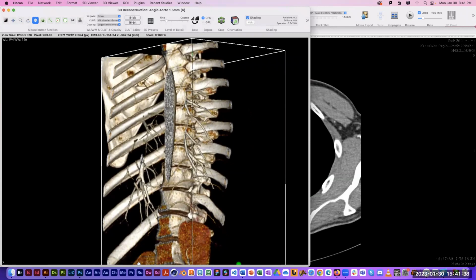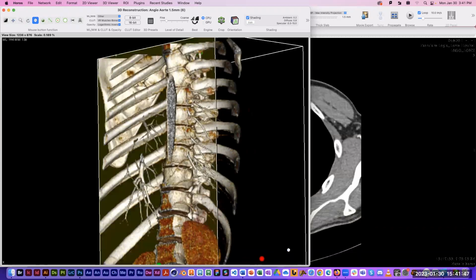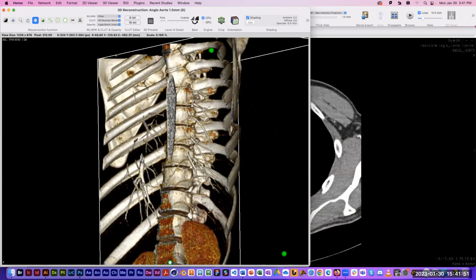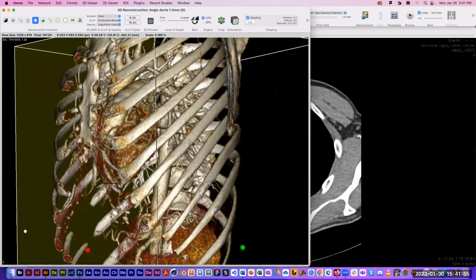Still can't see the one in the front. It's going to let me. Nope. It's rotating it. Shoot. All right, well, I'm going to drag this left one over. All right, now I can see the one in the front. Drag that one out, put everything back on.